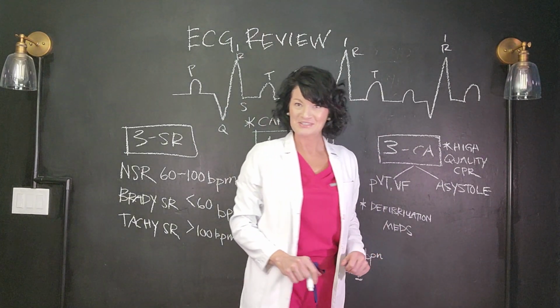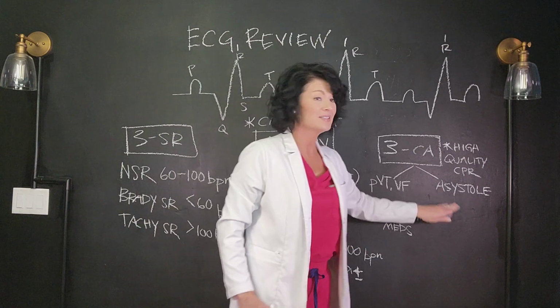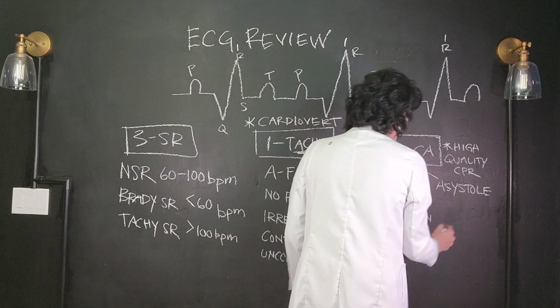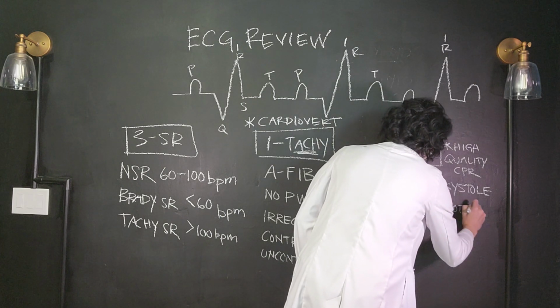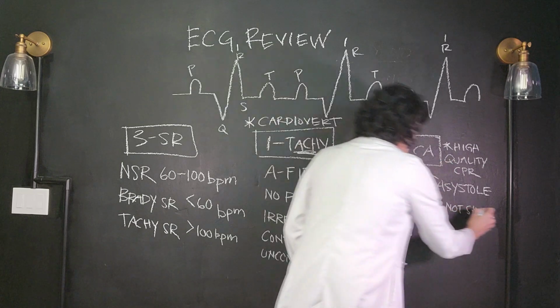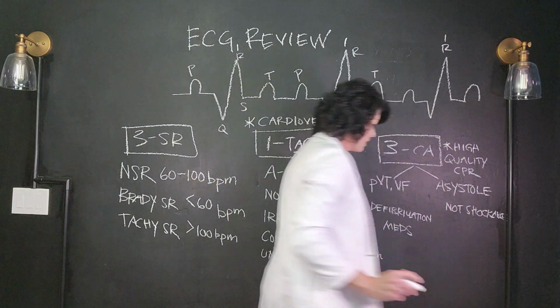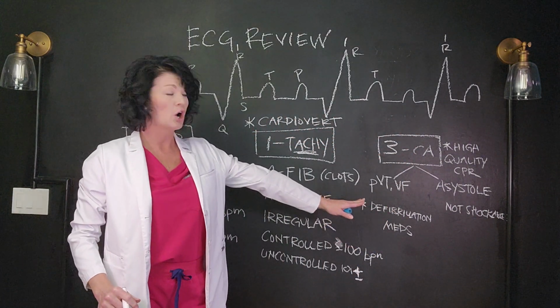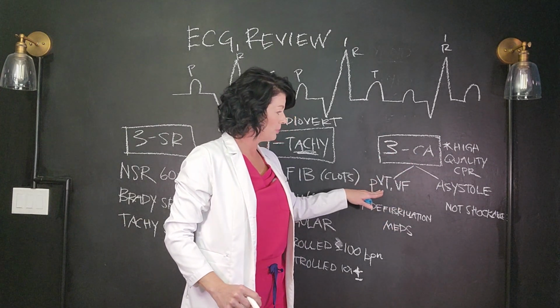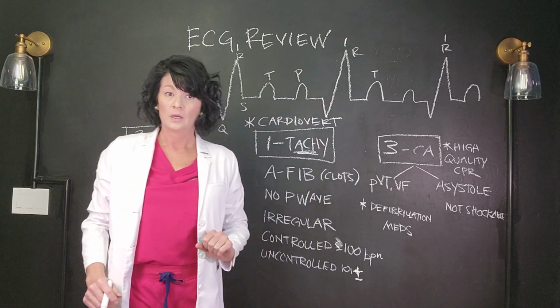Asystole, contrary to what a majority of medical shows like to show you on TV, asystole, your flat line, is not a shockable rhythm. So if you see a flat line, it is not shockable. All you're going to do, high quality CPR and give medications, okay? All right? But no matter what, guys, in the cardiac arrest rhythms, you still got to go back to what caused your patient to go into pulseless VTach, V-Fib, or asystole.